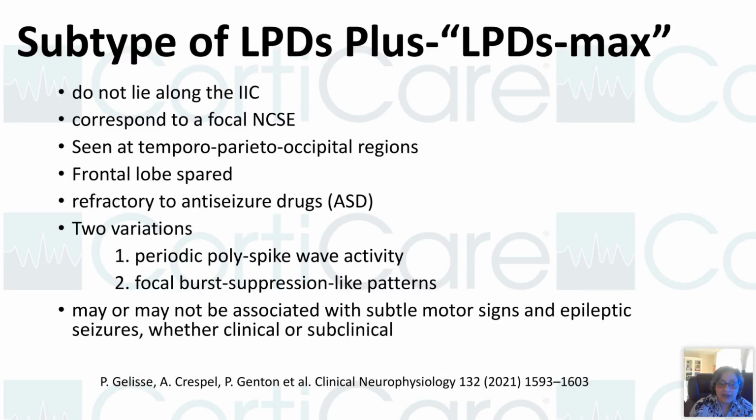Now, these patterns may or may not be associated with motor signs. Most of the seizures that patients have with LPDs have very minimal motor involvement or they are subclinical. So we'll talk about the reason for that.